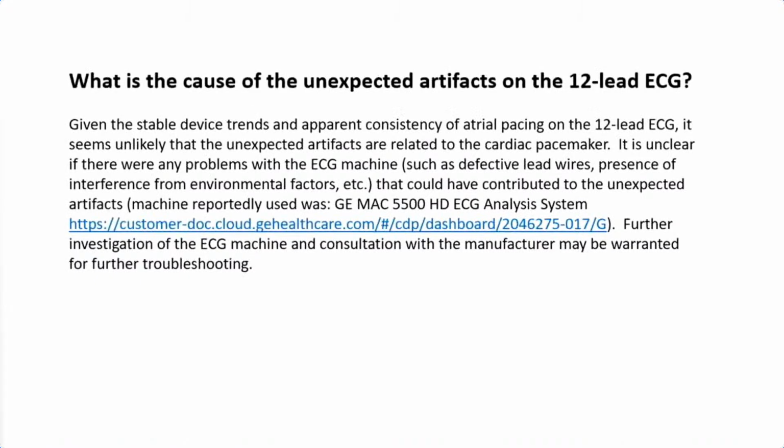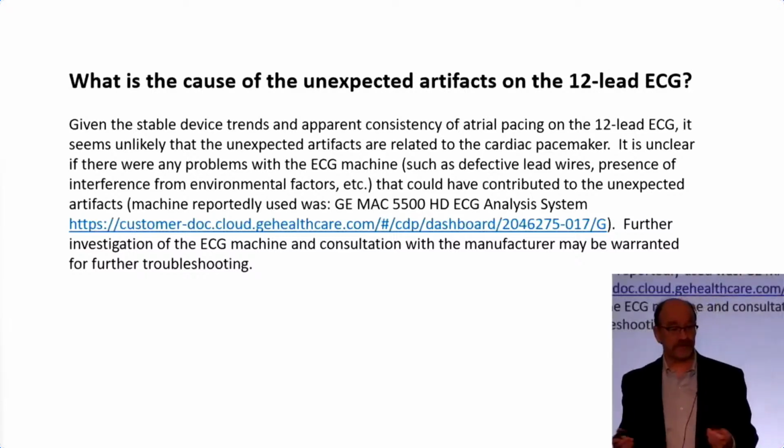So I went back to the manual, and this is the best that I could find. They said, is there any problem related to the EKG machine? That's the EKG machine I was using all day long, plenty of patients coming in with pacemakers. It really is unexplained. The pulse width on a pacemaker is typically about 0.4 milliseconds.